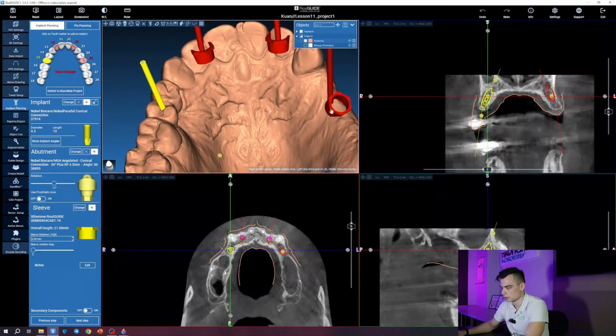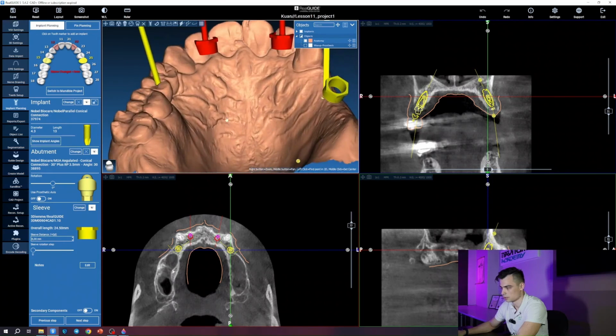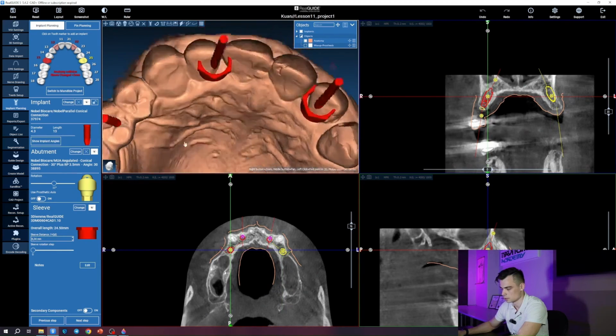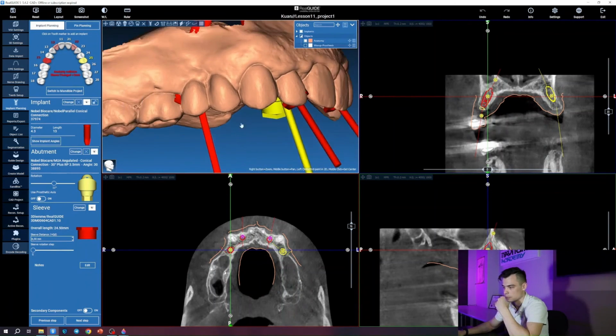All right, here let's also add 3 millimeters, considering that we'll be using a 16 millimeter drill. So we add these 3 millimeters here. Here, this problem disappears, which is very good. And here as well, it's about to light up red because it's pressing against the mucosa, which is understandable. There you go.